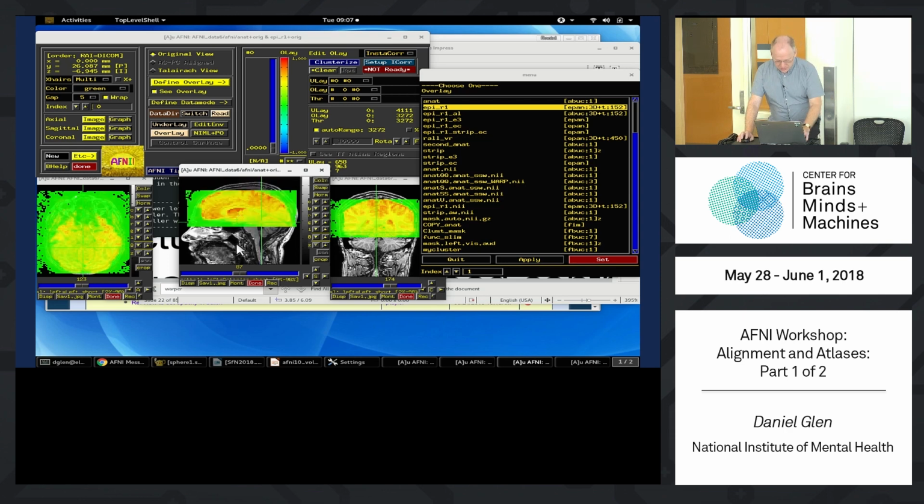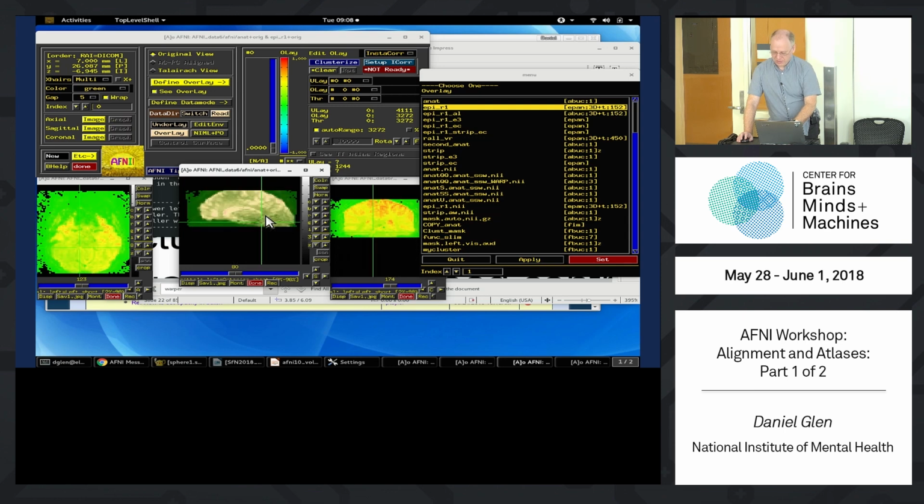Just to remind you, the E key, combined with a lower opacity, shows you a quick way to get an edge display. That was the E key for edge enhancement, and that's a toggle. The O key turns the overlay on and off, and the U key is an underlay toggle.